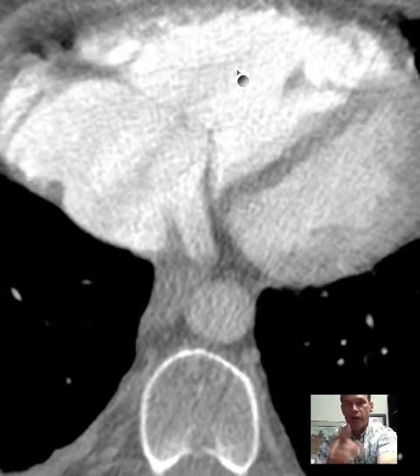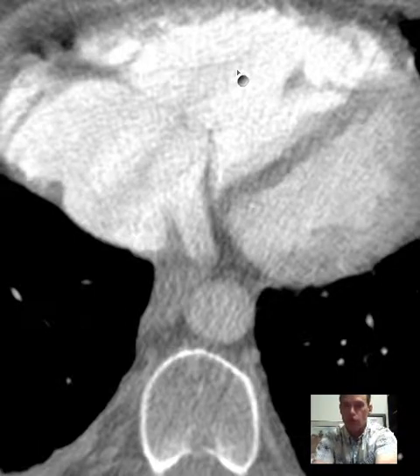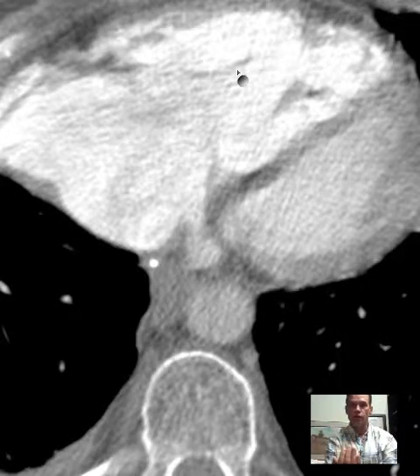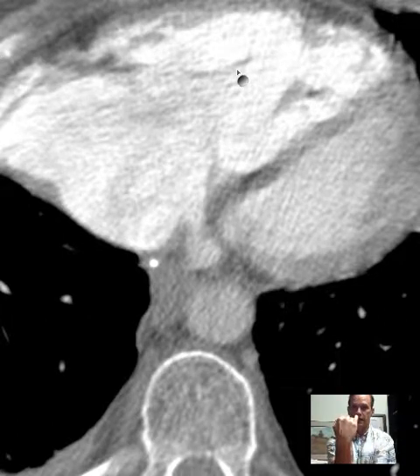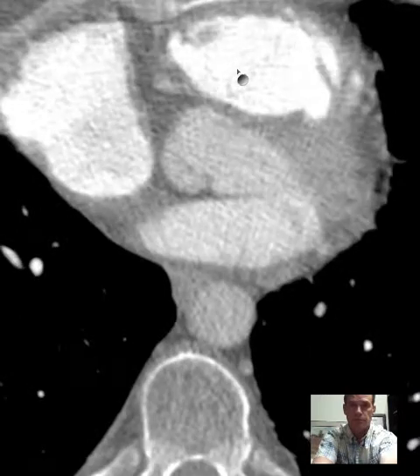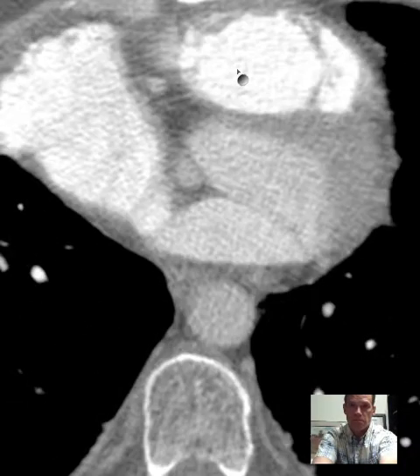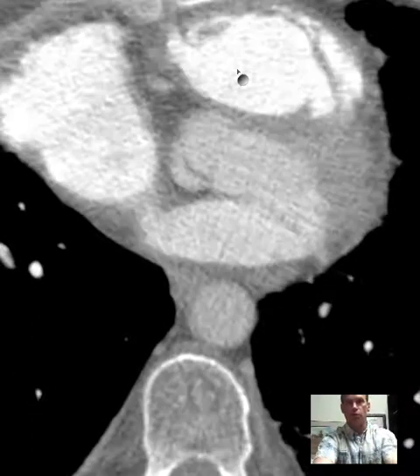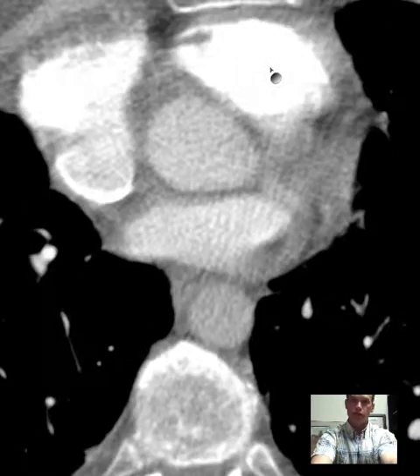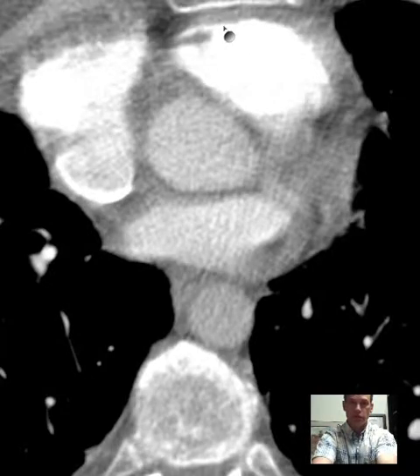Now, keep in mind, where is the right ventricle going to give rise to the main pulmonary artery? Remember that it's very anterior, so it comes, this is the sternum, comes up out of the right ventricle and arches back. And then it branches right under the aortic arch. Let's see if that holds true here. Here we are in the right ventricle, the course upward. Here is the main pulmonary artery exiting superiorly, just posterior to the sternum.